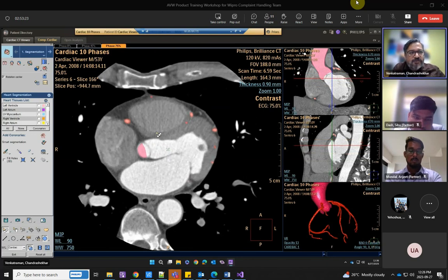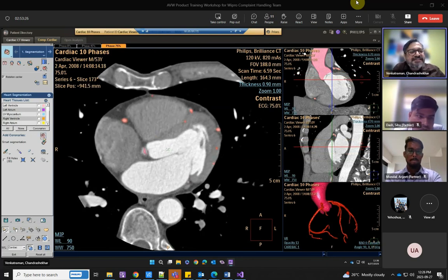The purpose of the segmentation stage and these tools is that although the algorithm is efficient enough to segment most parts of the coronaries, sometimes, for example if Siemens introduces a new CT scanner and unfortunately it's not under our coverage of multi-vendor support, it might not be able to segment completely. Some vessels might be left out here and there, and you might come across certain issues related to that.